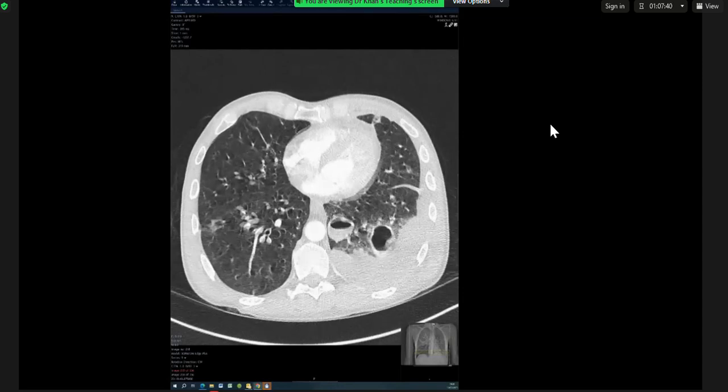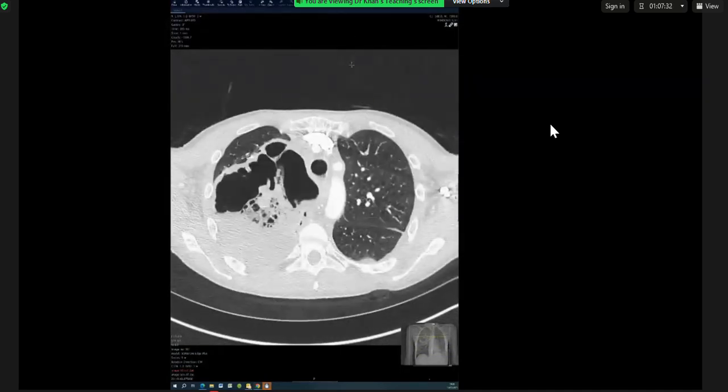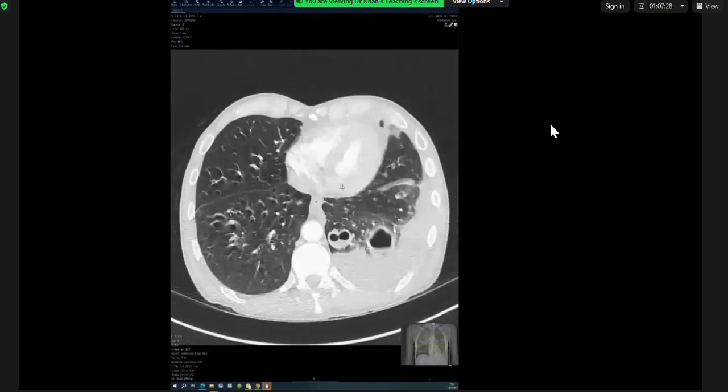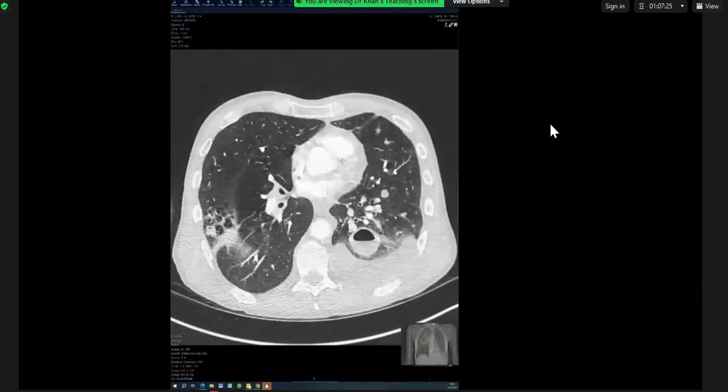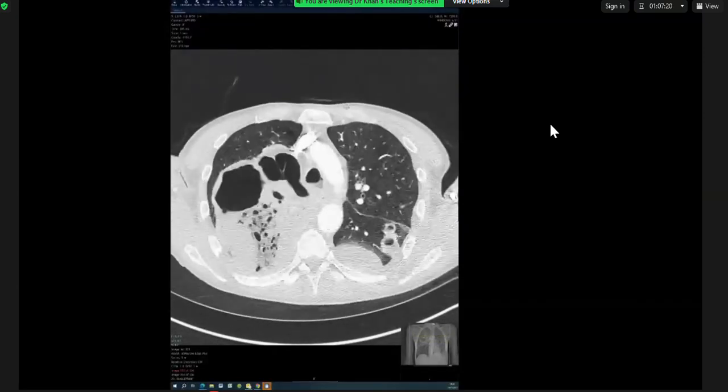One of the differential diagnoses, in the context of a fluid level within, may be multiple abscesses, maybe septic emboli with the complication of flaring of the infection, maybe vasculitis granulomatosis. However, the typical course doesn't go aggressive like this. The lesion in the right lung is so large. So my differential diagnosis includes multiple abscesses, multiple septic emboli.